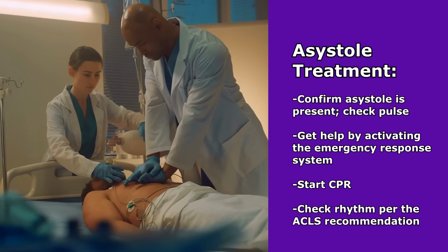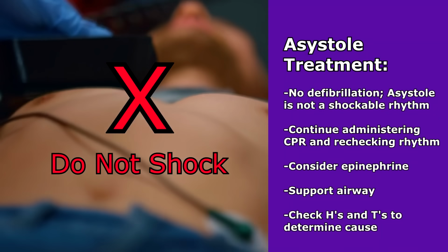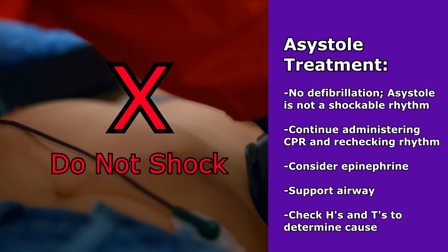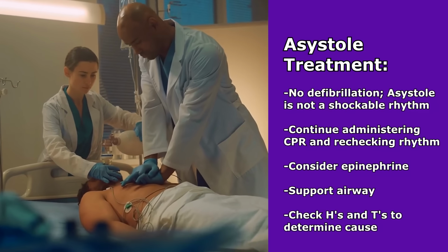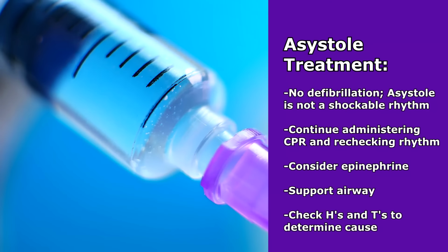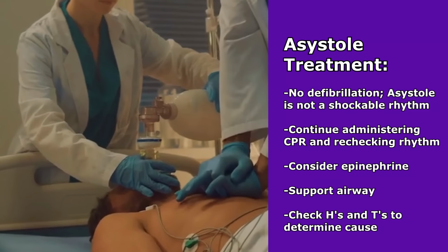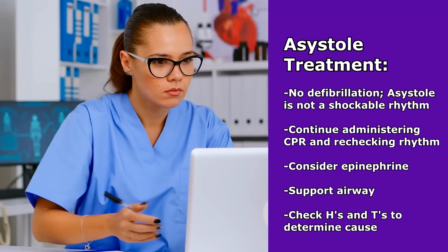Then you want to check the rhythm per ACLS's recommendation. Asystole is not a shockable rhythm, so we cannot defibrillate this rhythm. So you want to continue doing CPR, doing rhythm checks per protocol. Some things that can be given: you can administer epinephrine, you want to support that airway, and of course as you're continuing CPR and rhythm checks, you're going to be checking those H's and T's, thinking about what could be causing this.